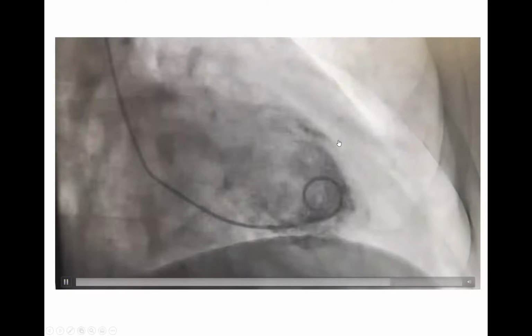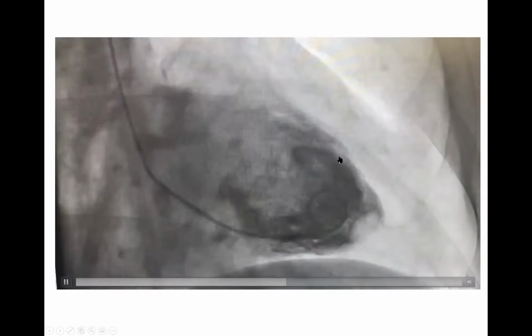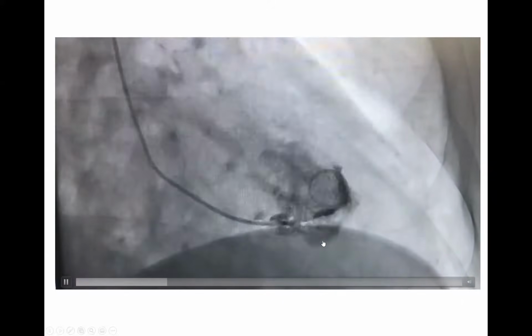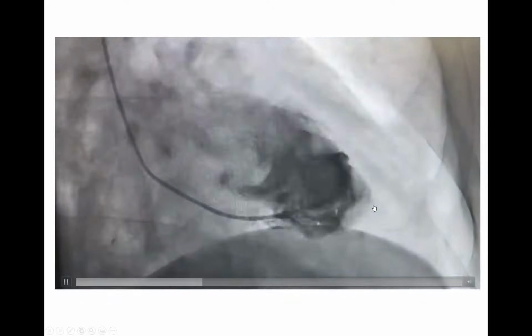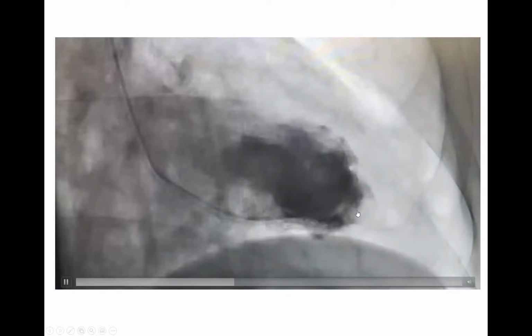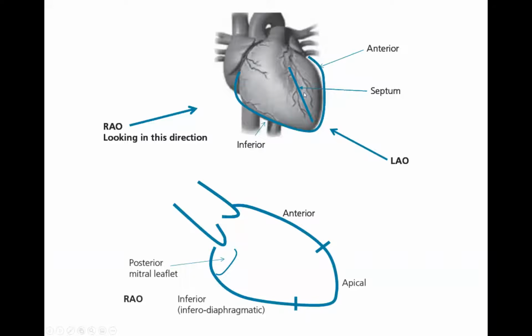This patient had a distally occluded LAD with absolutely no collateral. In retrospect, this territory is an indication in this particular patient of an old infarct with non-viable myocardium. But again, dyskinesis is not always non-viable myocardium. Aneurysm is non-viable myocardium, but dyskinesis doesn't have to be. It could be reversible. So I just wanted to show the value of an LV gram. This is what an LV gram does.